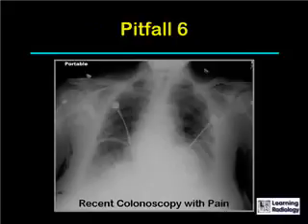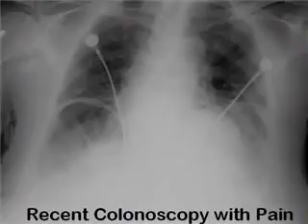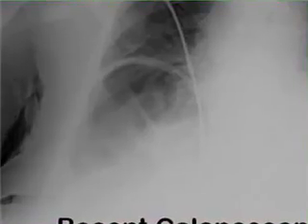So here's another example. This patient had recent colonoscopy and then began complaining of abdominal pain. A portable upright chest x-ray was obtained. What do you think?